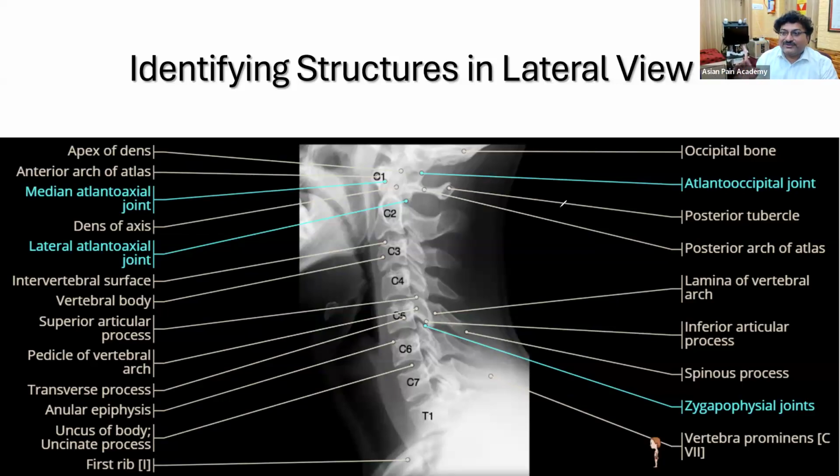Okay, so these are all differences that you have to know, and especially while doing cervical procedures, you have to be very, very careful. Now, I am drawing another box. So let us take a different color and let us take a box here. So what is this structure? This structure. Lamina. These are the overlapped lamina of both sides.